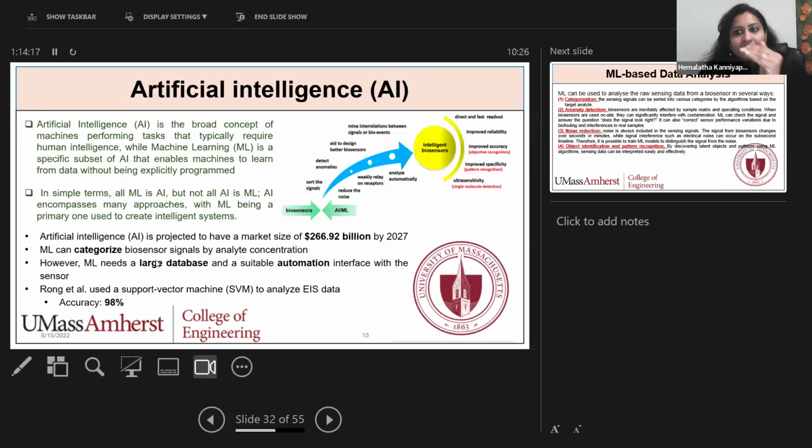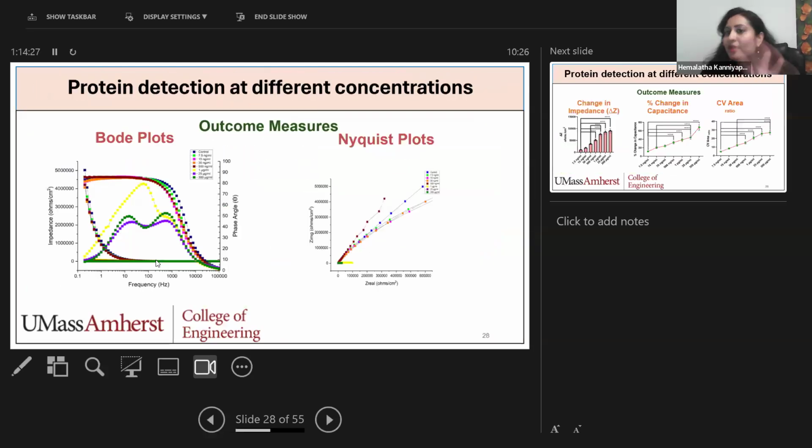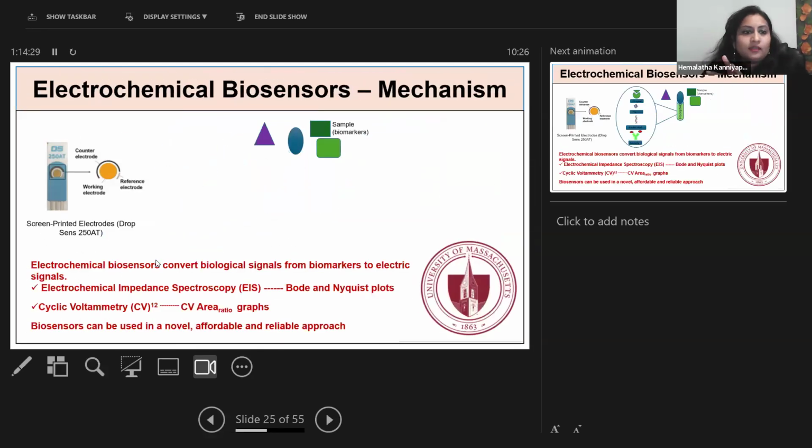So that's the reason it is giving low risk. The low risk might be between stage 1 or 2. So you can play around with the selection of biomarkers.